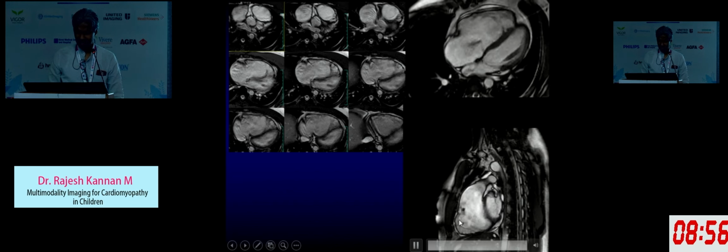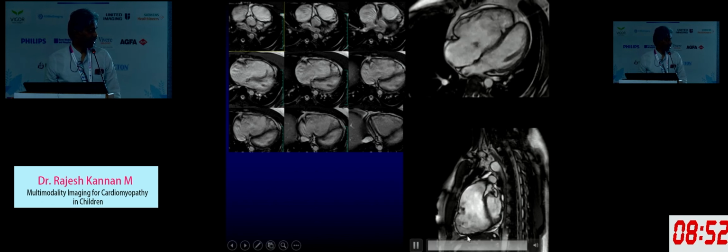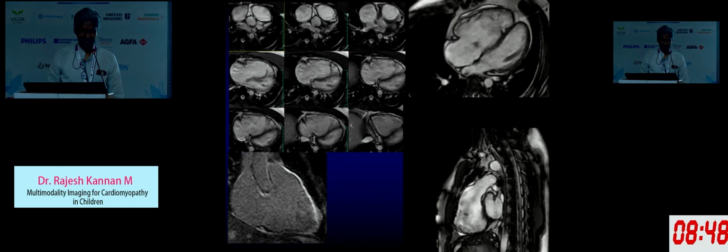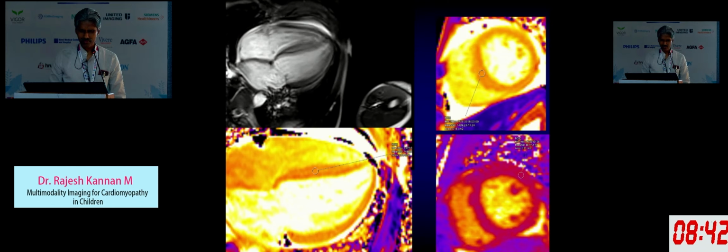Again, the RVOT view clearly shows that there are multiple focal outpouchings, and also in this case the LGE showed a significant myocardial delayed enhancement on LGE.